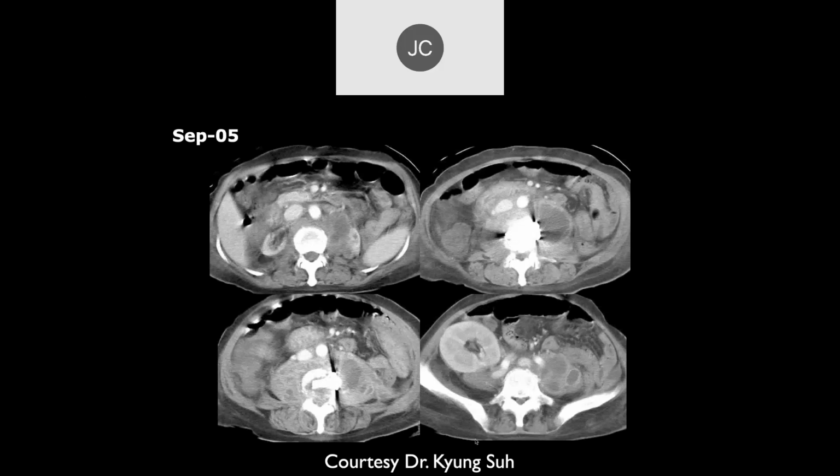Here's the CT scan. There's a lot of soft tissue, peripherally enhancing. Looks like abscess. Now, if you see big abscesses in someone who's not all that symptomatic, they're often called cold abscesses. What does that make you think about?